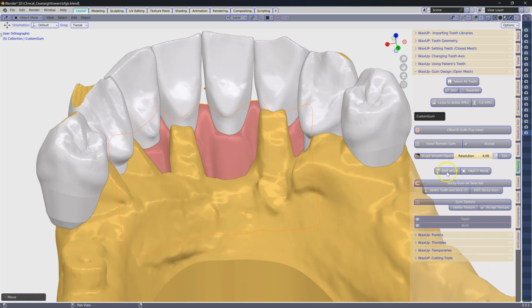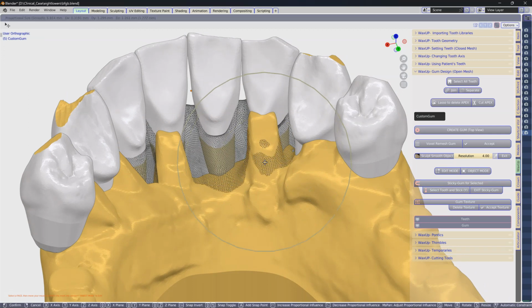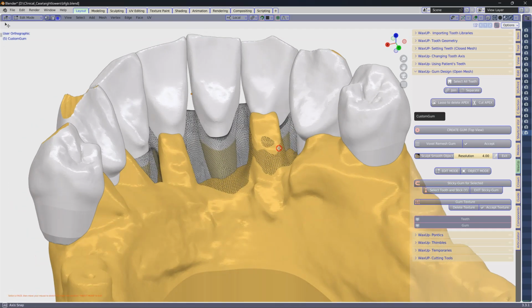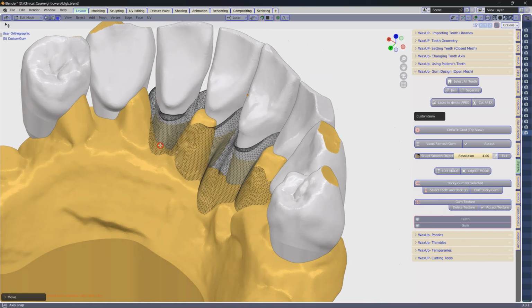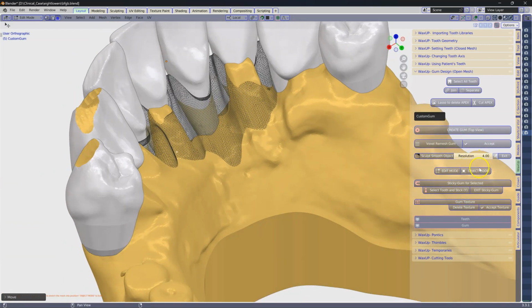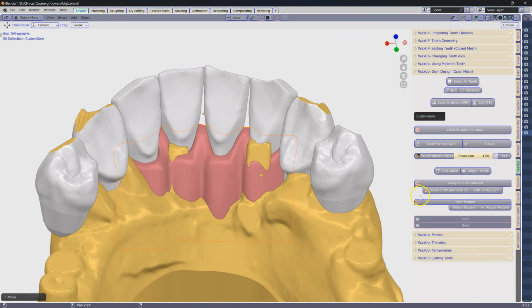So I'm going to go into edit mode again and I'm going to left click and use the G key to pull it to my stump. Something like that. Okay. And this will make sense very soon why I'm doing it. That's looking good. And then object mode, and that's good. Just give it one more smooth.